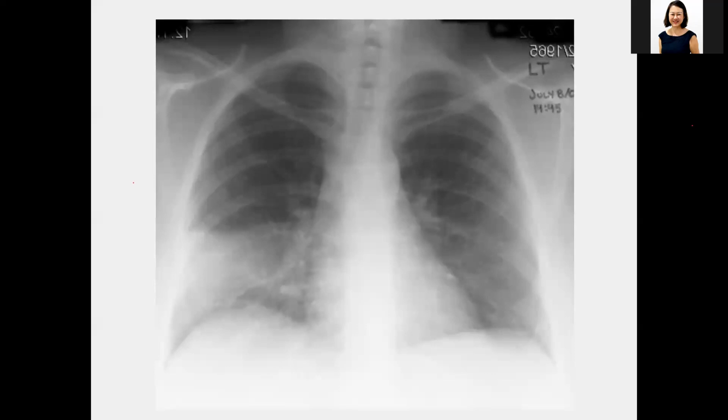This looks like a lobar pneumonia. So if you look at clinically, I think you have to also think, oh, this is a lobar pneumonia, but I don't see anything over the right. Sorry, the left, I mean. Over the left, yeah, there's nothing on the left actually. Maybe the quality of this film is a bit blurred.